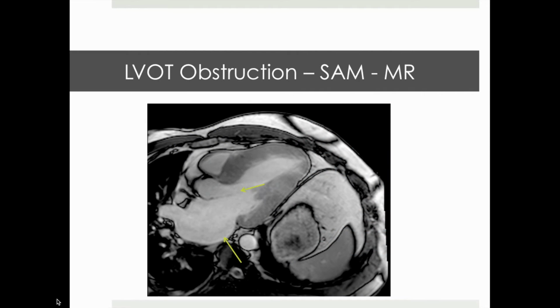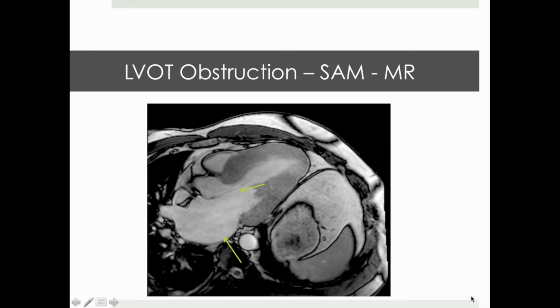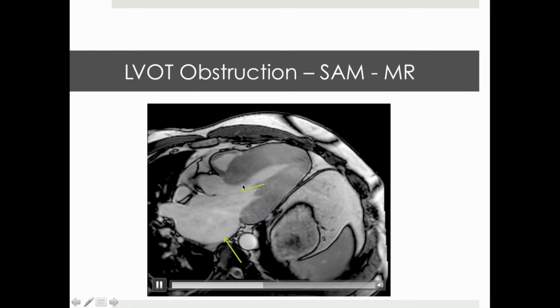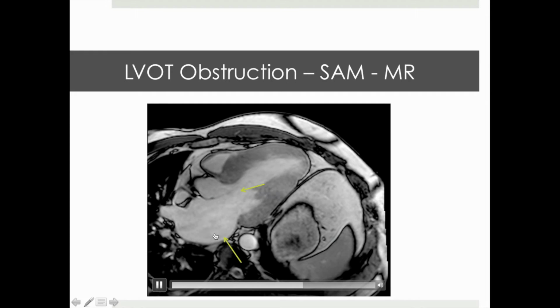Cardiac magnetic resonance can also be helpful with visualization of flow acceleration and flow obstruction phenomena, which most commonly affect the area of the left ventricular outflow tract. Flow acceleration consequently affects the function of the mitral valve by pulling the anterior mitral valve leaflet into the area of flow acceleration within the LVOT. Displacement of the mitral valve leaflet happens right in the middle of systole, that is, at the time when the mitral valve is supposed to be shut. The valve function is consequently impaired, as evident by the presence of an eccentric, posteriorly oriented regurgitant jet.